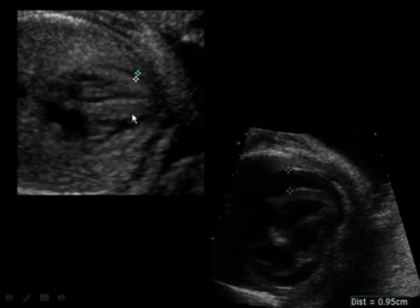So what do I mean by that? Well, here's a possible pericardial effusion seen here. But this is actually just the edge of the myocardium. You can see some echogenic inner edge and then the hypoechoic myocardium here. When in doubt, try to identify whether this possible fluid goes past the level of the valves. If it crosses the level of the valves, it's much more likely to be fluid, as seen in this patient, where you see the myocardium here and the pericardial fluid going all the way around to the level of the mitral valve.